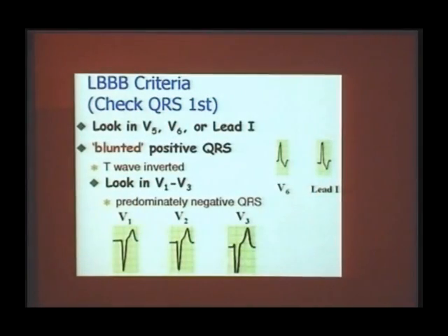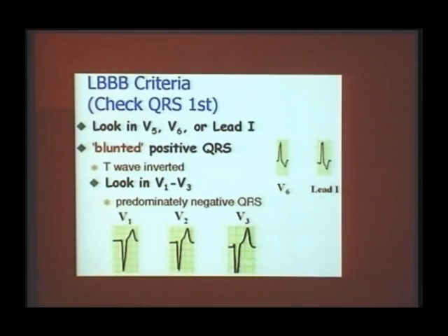Right. Whereas you look at this ECG. Here you see V5, V6, and you look at L1. You see exactly similar QRS complexes in V6 and L1. Almost similar. So here is QRS widening. The terminal component is what? Positive or negative here? Positive. So what bundle branch block is this? Left bundle branch block. So just like looking at L1, it is possible to say whether it is a right bundle branch block or left bundle branch block, because L1 is going to mimic V5, V6.